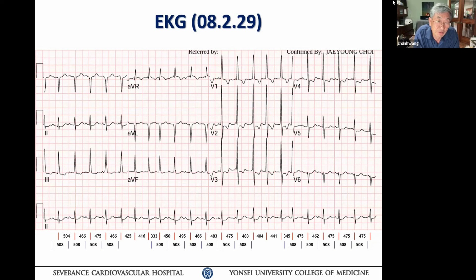And then the P wave, none of them conducting. I don't think so. Because if you look at beats 1, 2, 3, 4, 5, number 6. The preceding number 5 has a short PR. Can you see that? Number 5 beat, yes, short PR. And the next one has the same or almost the same morphology, a narrowish looking QRS complex with a P wave inside the QRS complex.